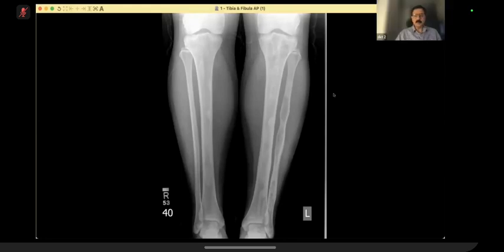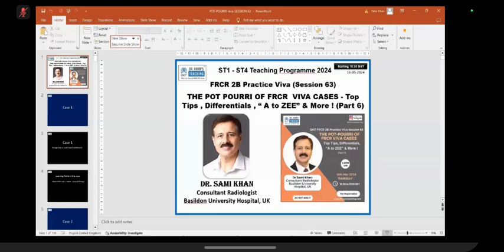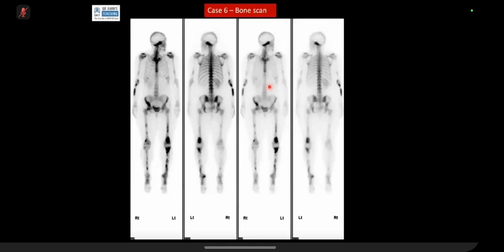What is your conclusion? My conclusion, this is a case of polyostotic Paget's disease. I will refer this case. This case usually, mostly, is already diagnosed. I'll discuss the findings with the referring physician, and I will review the available images of the patient. If there is a new concern for the patient, new development of pain, I would like to review this area specifically and compare with the previous images. That's it. Thank you very much.